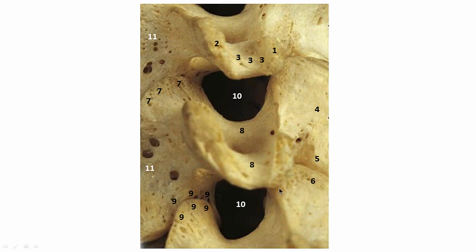Now back here, here's the good old-fashioned facet joint, which carries most of the weight. And what do these things do anyway? These uncovertebral joints allow flexion and extension of the spine as their main function. This would be the superior articular process of this bone, and the inferior articular process of the other. The facet joint, or zygapophyseal joint, or Z joint, would be right here.